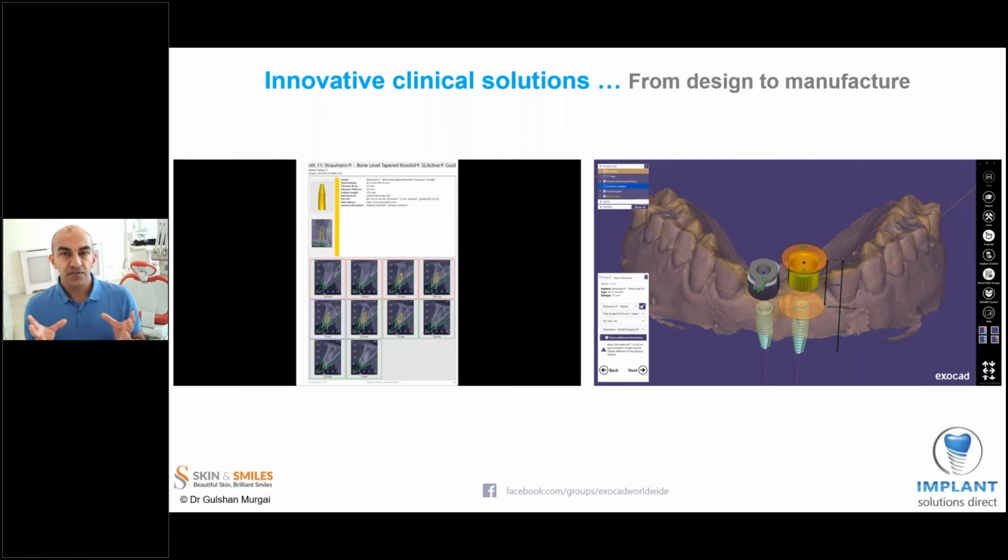So if the drill set is from a specific surgical set, you can actually position that sleeve so that when the technician designs the guide and you use that guide, when you make that primary osteotomy, you're drilling to full depth. Okay, so you're not getting a half depth or part depth. You can position it in such a way that if you use the right type of drill, you're drilling to full safe depth.